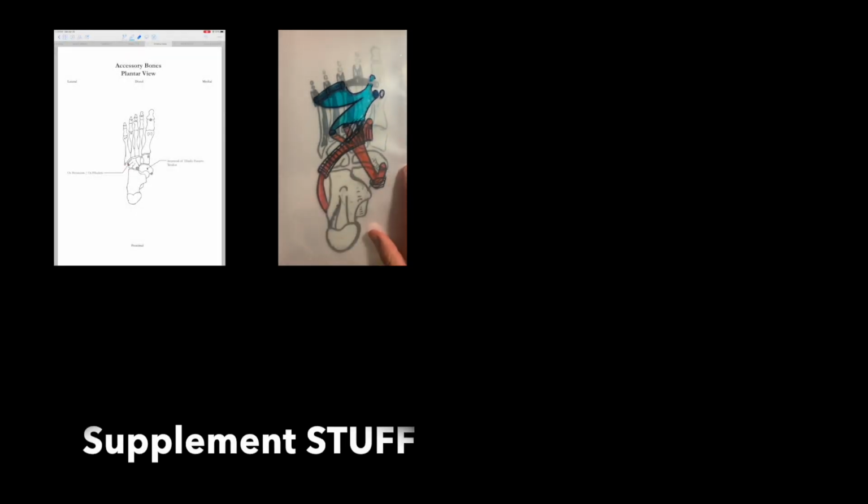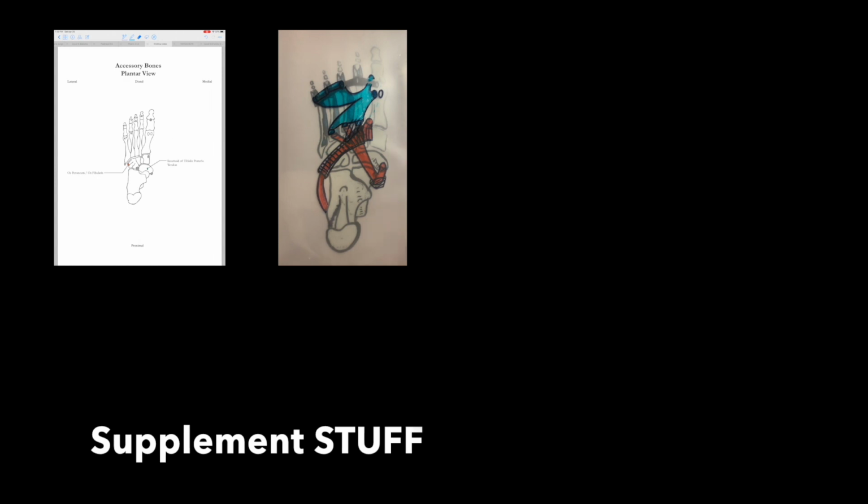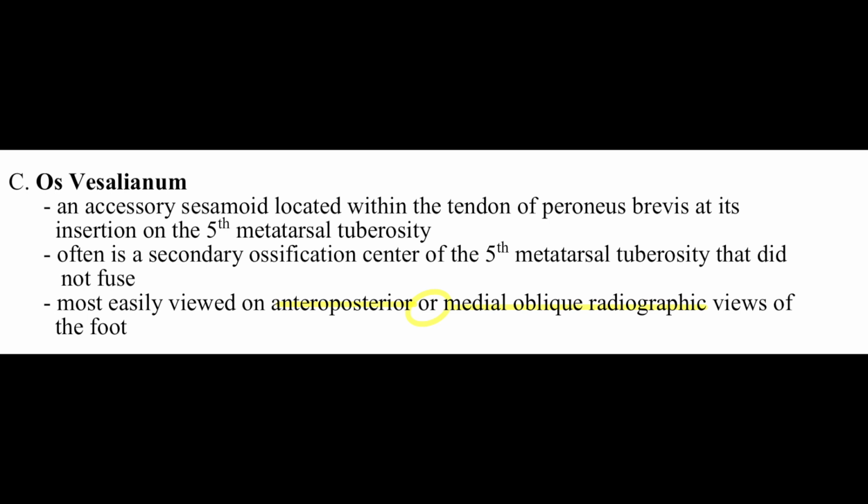Hey guys, what's happening? So this video is made to help supplement the accessory ossicle video as well as act as a short introduction to radiographs. I'm definitely not a pro when it comes to radiographs, but to help answer some anatomy questions I got from this section, it came to my attention that with little knowledge of radiographs and seeing something in your notes like this, or in a sense, how is the laterally located bone seen most easily with something called medial anything?